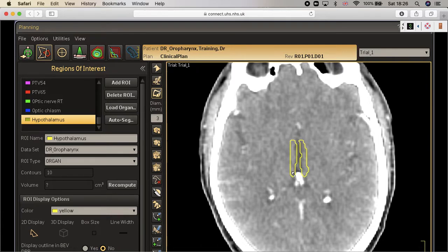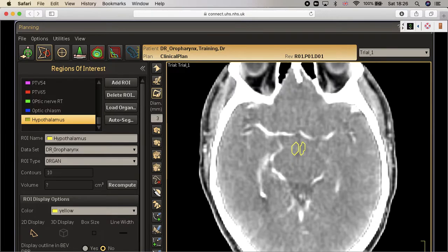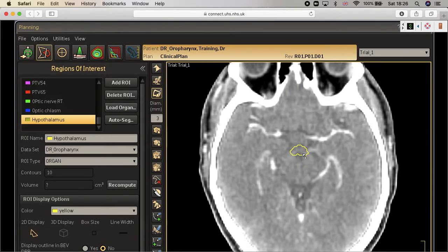Okay, so it's easy. Let's repeat the steps and then go to the MRI and try to do it there. So localize the optic tract. Write down with me and we go to the MRI now. On either side of the optic tract, this is the starting point of the hypothalamus. If you can't see the mammillary bodies, take the mammillary bodies with you. This is also a very simple thing to do.